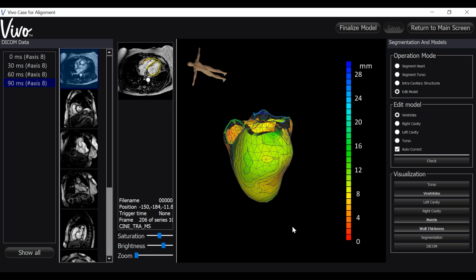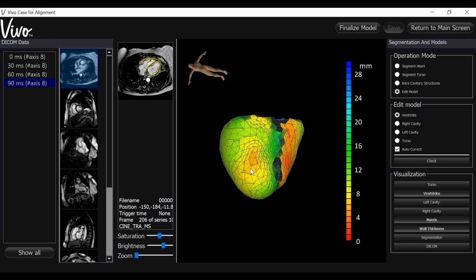To adjust this wall thickness, you're going to press Control and left click on your model. The area will appear white, and while holding the Control button and scrolling up and down with your mouse, you can increase or decrease the amount of area in the white. So I'm going to cover the amount of area that I want to increase here with the white.